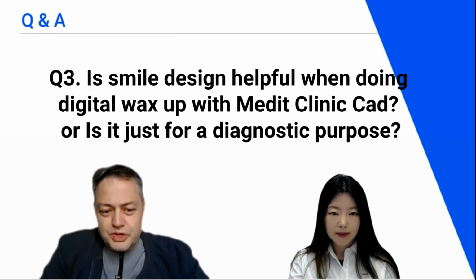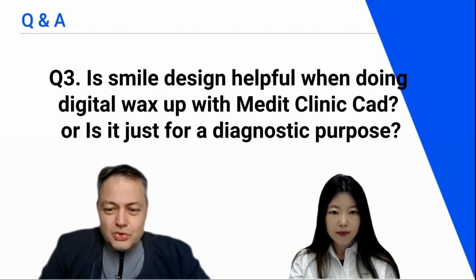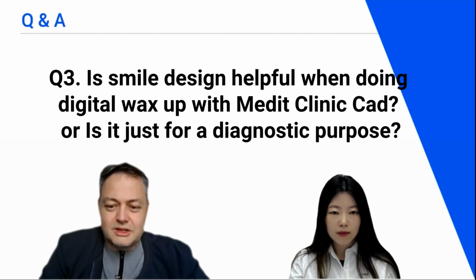And as I showed you in the webinar, you place a grid over the teeth you are working on. And now, because you have the values from Smile Design, you are going to be able to adapt the teeth that you are working on with the grid. For example, if you have 5 millimeters of width for a tooth, you're just going to use the grid to get it from that set viewing point to that 5 millimeter with the grid, because every square is 1 millimeter. So it's going to be easy to adapt the teeth you already have by the grid that overlays.